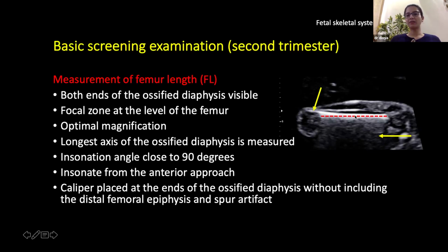This is because when a femur is normally mineralized, we see this distal shadowing. So we are not able to see the structures distal to this femur in the leg because of this shadowing from a normally mineralized femur. And this is what a normal mineralized femur looks like in the basic exam.